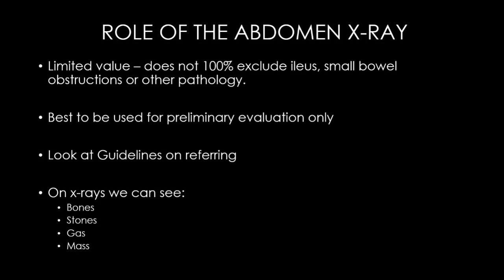In chronic pancreatitis, x-rays are less sensitive than CT, as with most things, but you might see calcifications developing over time within the pancreas on the x-ray. For small bowel obstruction, x-rays can show if it's present, and we'll talk about that when we review the abdomen in a minute, but they can't exclude it, and they can't determine the cause in most cases. So again, that's where CT comes in to confirm diagnosis, indicate the level, and show the cause.